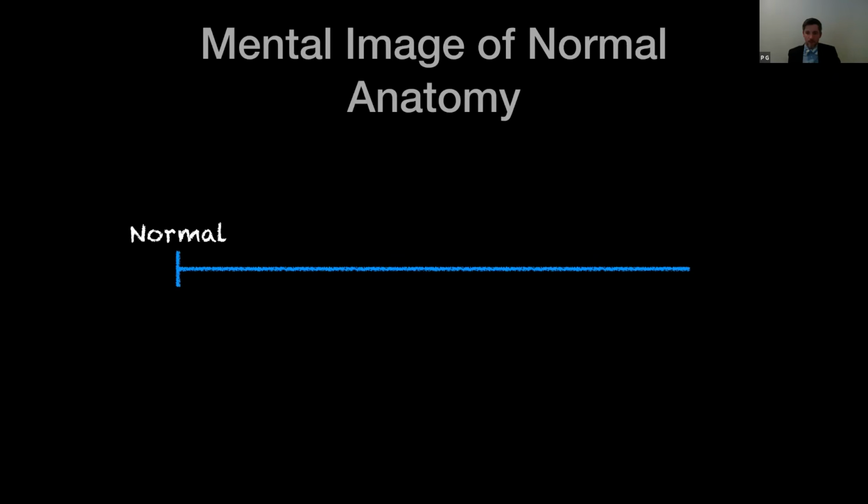And then if you know what normal anatomy looks like, you should be able to pick out pretty quickly what abnormal looks like. But the more of these scans that you look at, if you're scanning your patients, you'll notice that there's a middle ground. Sometimes we do come across anatomic variations that are not necessarily pathologic or abnormal. They're just considered to be a variation of normal.